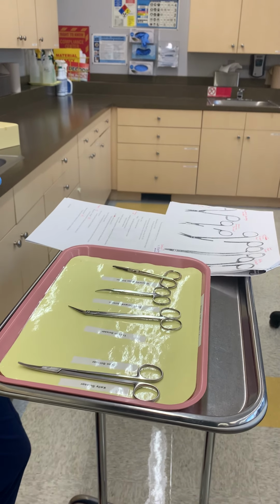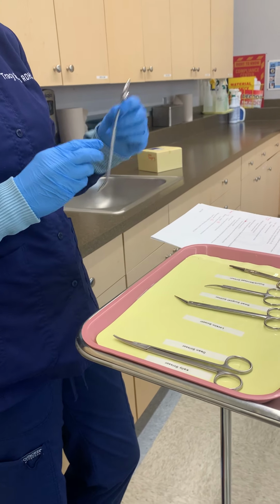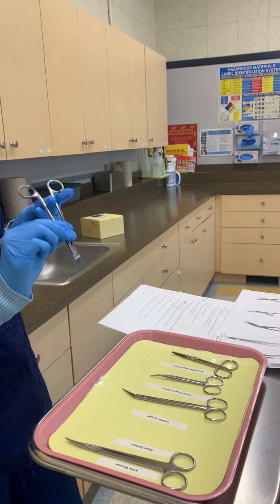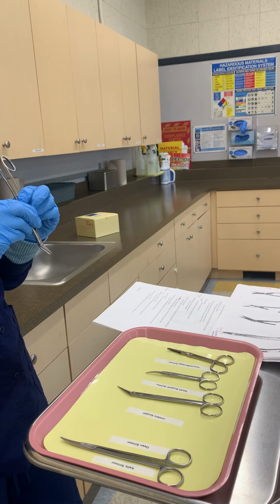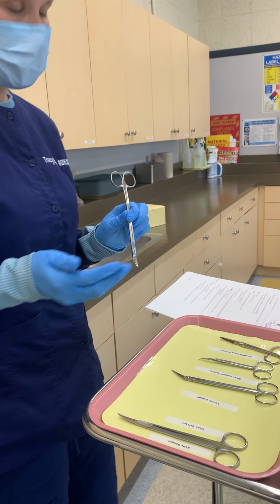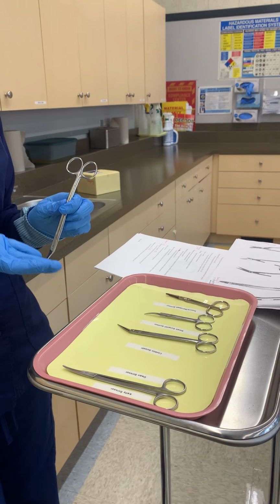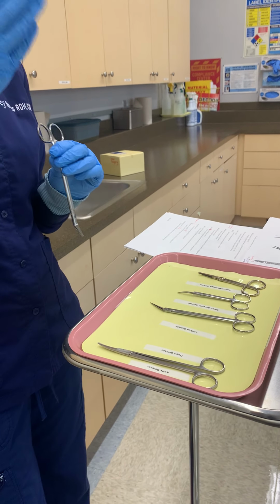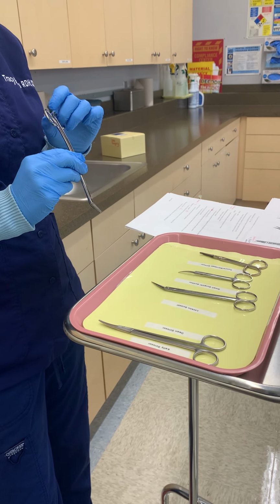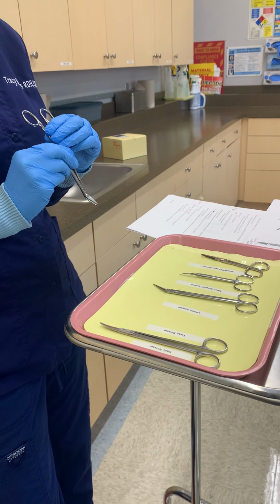Next, we have the Dean tissue scissors, or the number 599. These are also going to be used for removing larger portions, but this is going to be typically for interproximal tissues, okay? Dean interproximal tissues. So a lot of these scissors are going to look alike. A lot of them are ultimately being used for the same thing, right? Cutting kind of tissue or any kind of pellicle that might be left behind. They all are also going to be able to be potentially used to cut sutures, but their primary goal is going to be removing the tissues.